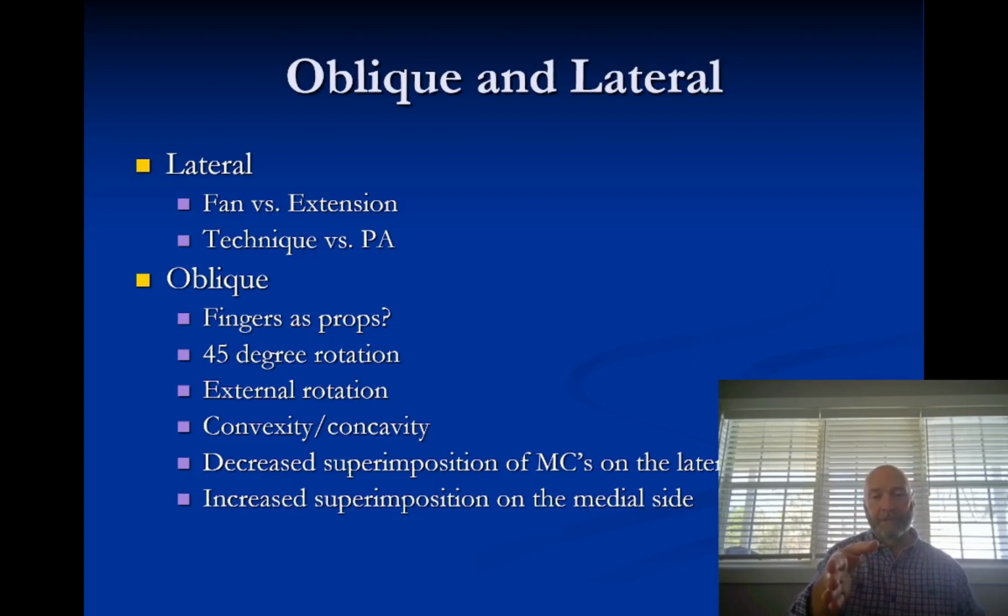The purpose for this really is that you can see the anterior posterior separation of fractures in the metacarpals and possibly in the phalanges. But what we see in this most clearly is if the patient has some sort of foreign body. So let's say the patient works with metal and they got stabbed by something at work and they've got a foreign body inside of the hand.